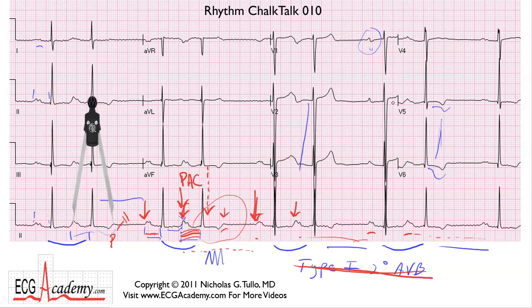What do we call the pattern when an ectopic beat occurs every other? It's bigeminy. I think we've seen this before. This is atrial bigeminy with a first-degree AV block, but there's no second-degree AV block here. All the P waves conduct. What you have is a first-degree AV block, but the bigeminal pattern makes you think that it's Wenckebach 3:2, but it's not. It's a common mistake that people make, and I wanted you guys to see this. We had seen atrial bigeminy in the past that was non-conducted, but these all conduct, and it gives the appearance of a second-degree AV block, but it's not.